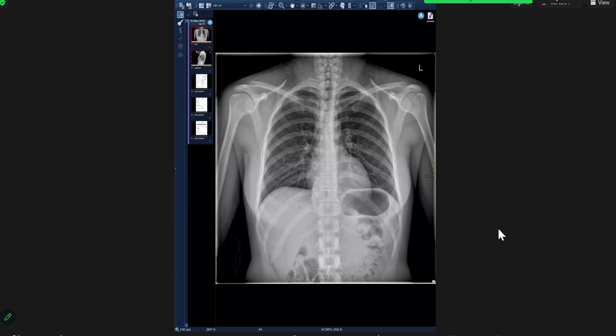So what stripe is this? It is the right paravertebral stripe. Right paravertebral, yeah, ma'am. The paravertebral stripe is elevated from T9 to T11, right? Yes, ma'am. And you said you don't see calcification. I'm just repeating these things because this is also an important film. Some of the things you said were really nice.